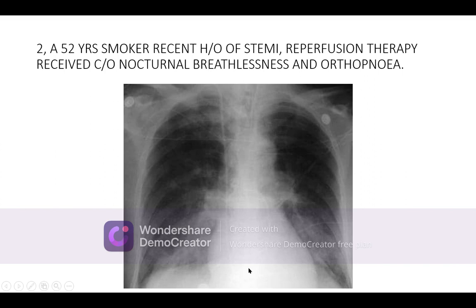Tuberculosis in any case should be excluded, although the history does not actually support this. Fungi will not cause this type of lesion; micro or macronodular lesions are the most common presentation. An allergic reaction will not cause this, for example extrinsic allergic alveolitis. Sarcoidosis will not cause this. Autoimmune diseases have a reticulonodular pattern in most cases.